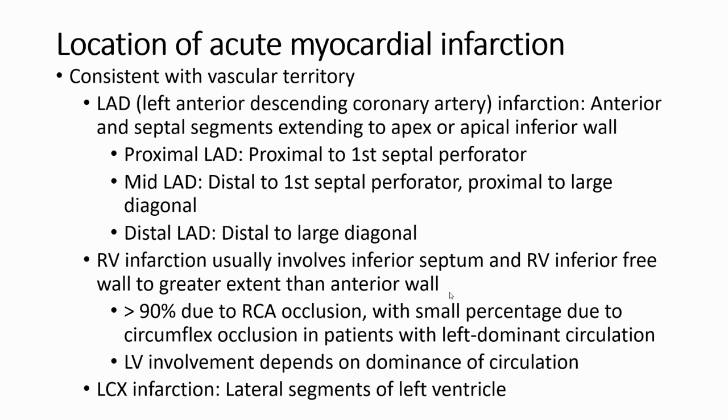Regarding location, acute myocardial infarction is divided, first, into left anterior descending coronary artery infarction, involving the anterior and anteroseptal segments, extending to the apical inferior wall. Proximal left anterior descending coronary artery.